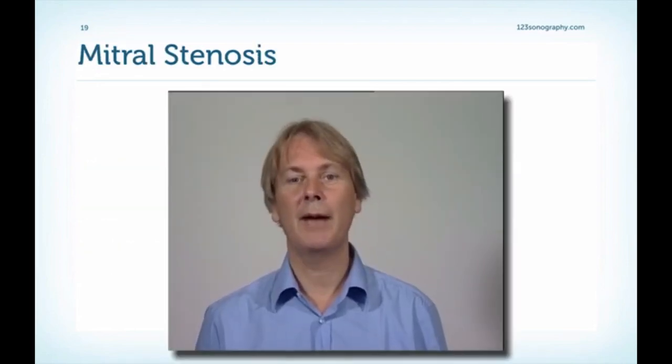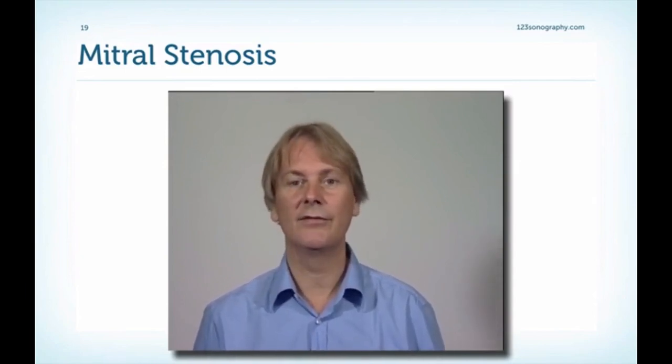So, this was some background information on mitral stenosis, in particular the hemodynamics, which will be very important when we look at the severity of mitral stenosis. But we haven't seen many image clips yet. It's time that we look at the echocardiogram and see how we can make the diagnosis and what we find in patients with mitral stenosis.